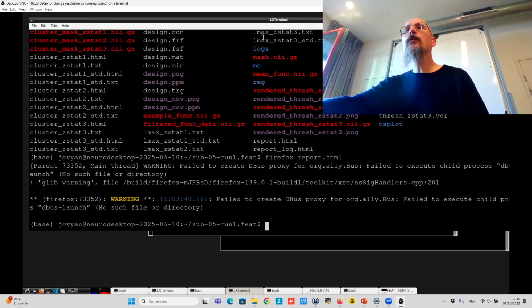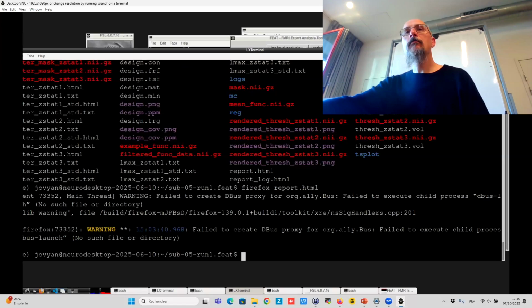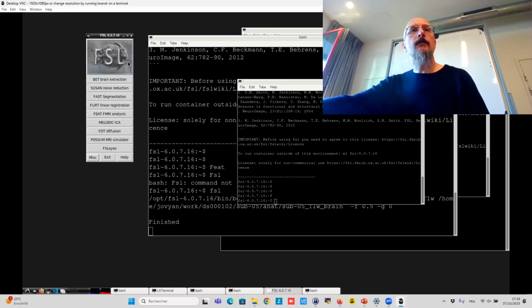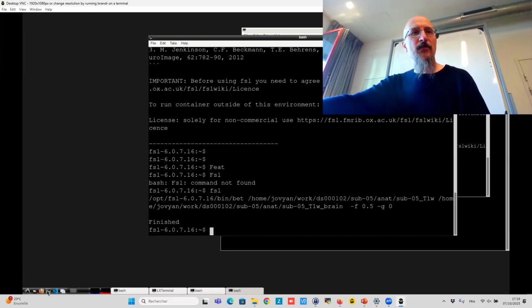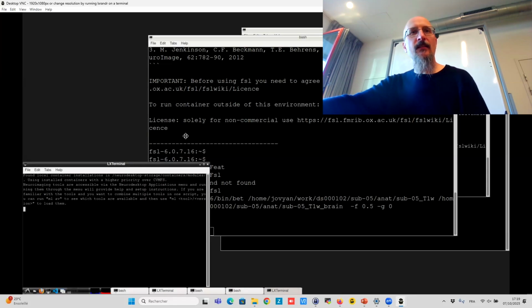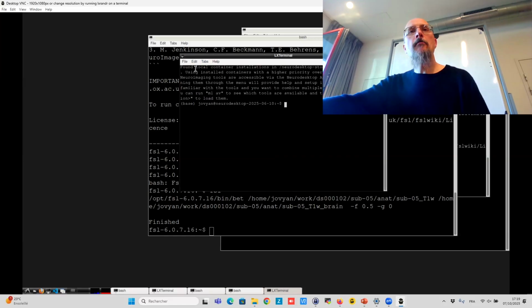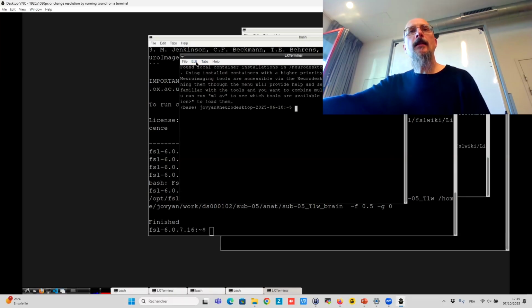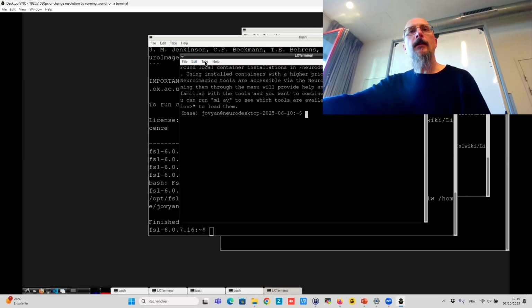I open a new shell. Is it working? Let's close it, FSL, bye-bye. So I want a new shell. Yes, new shell. Let's zoom in.